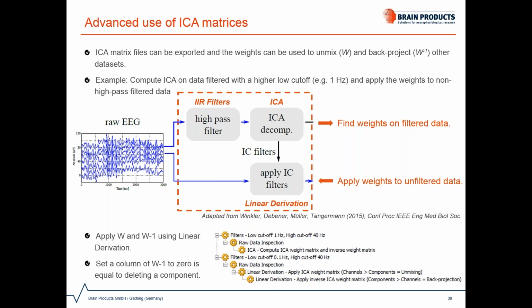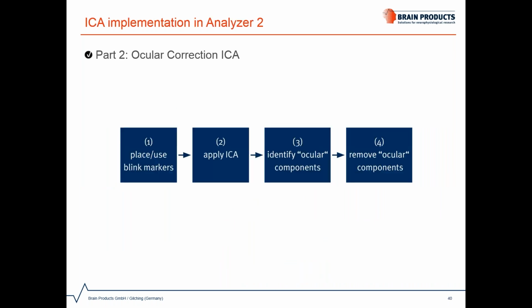Okay, now let's come to the practical for our second part. This will be a rather short one, but I still want to show you Ocular Correction ICA, as this is probably for most of you the main use case of using ICA on your EEG data.